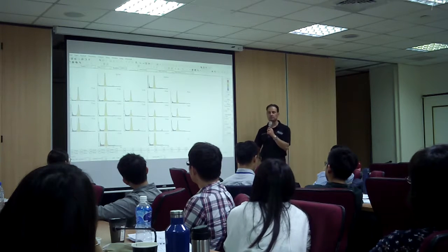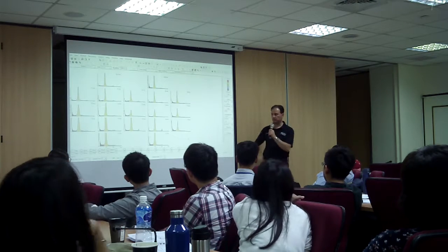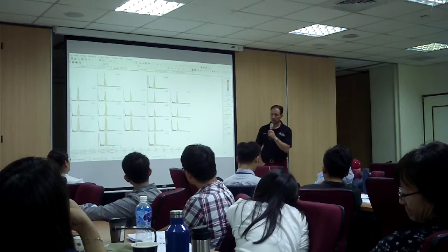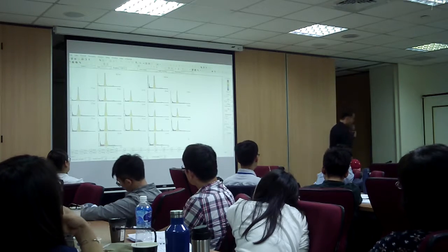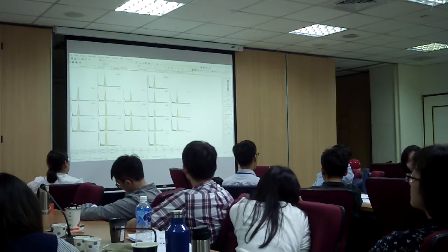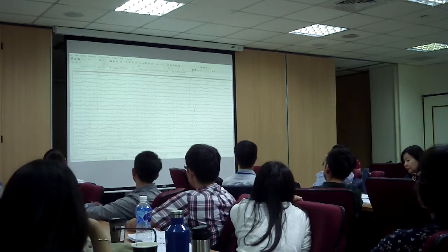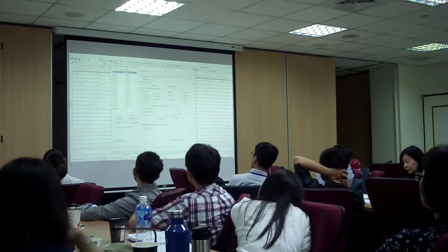And you get good mentoring, somebody who's done this before, and you get a good combination of things. All right? Now, I want to show you the other possibilities the software has. So we can do something called Loreta and sLoreta. So I'm going to go to analysis, and I'm going to go independent component spectrum.